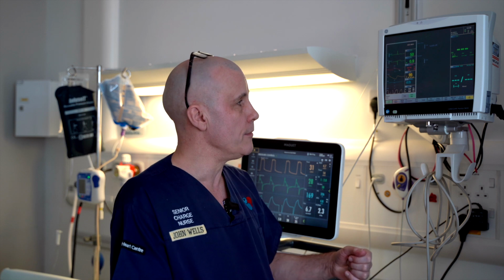If you hear it alarming, don't ignore it. They alarm a lot. Critical thing, don't ignore it. And what you see on there, if it's alarming, before you silence it, check your patient.